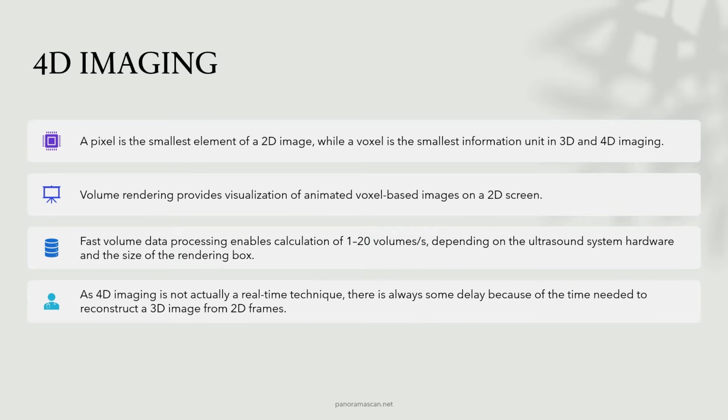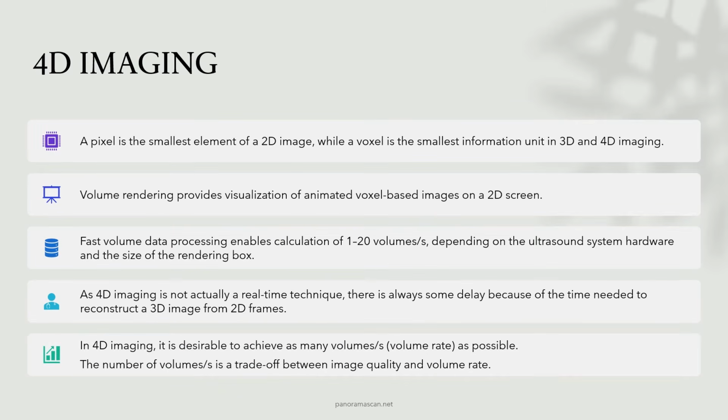Although 4D imaging is often described as real-time, it's important to note that there is always a slight delay. This delay is caused by the time required to reconstruct the 3D image from multiple 2D slices.